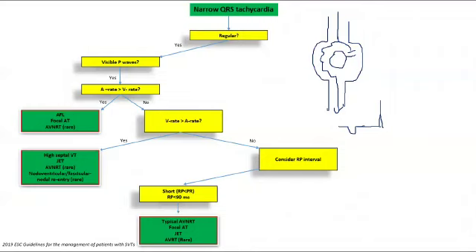So that by the time it gets here, the fast pathway is already ready to accept another impulse, of which this same impulse then conducts again retrogradely and activates the atria retrogradely, which is what gives you a retrograde P wave right over there at the edge of the QRS complex, which is why then you get a very, very short RP time. And this you see with typical AVNRT.